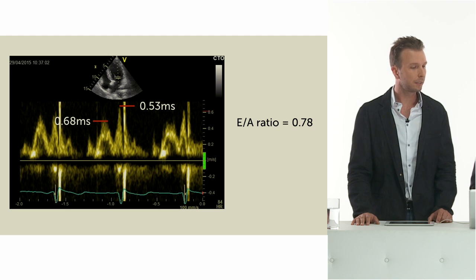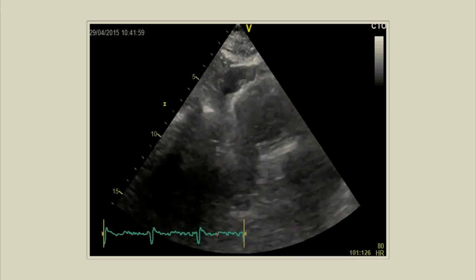Okay, so we've got diastolic dysfunction here, and what would the diagnosis be now? Normal ejection fraction and diastolic dysfunction. That's the diagnosis, but maybe not the diagnosis of the patient. Right. We'll see. Classically you would say this is a HFpEF patient, heart failure with preserved ejection fraction. All the criteria fulfilled. But again, I think it's so important to take a closer look at the image, and maybe you want to comment on that. Yeah, that's what I mean.